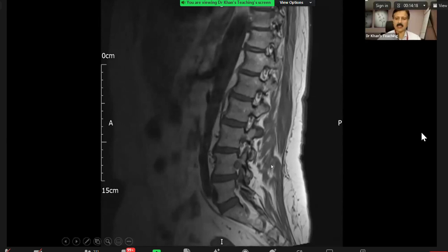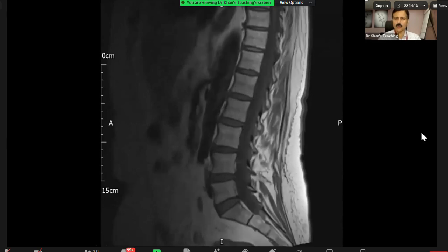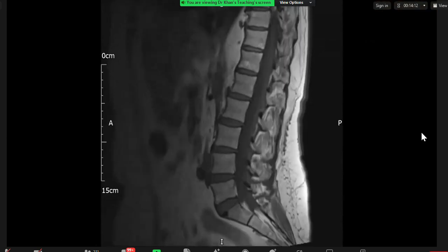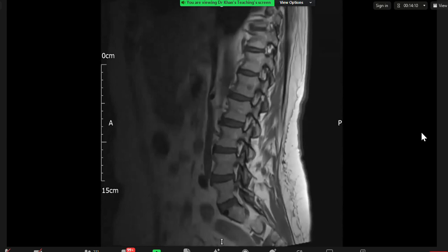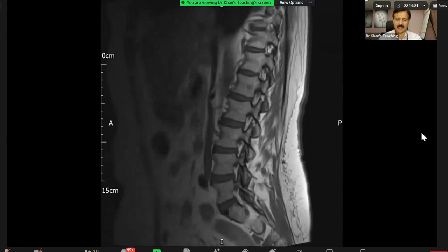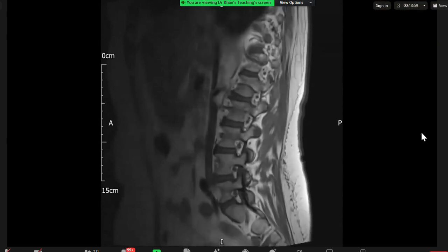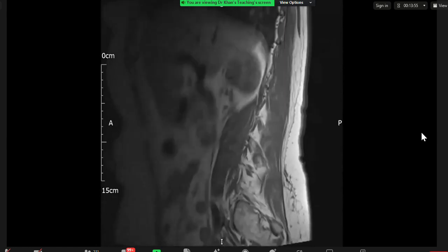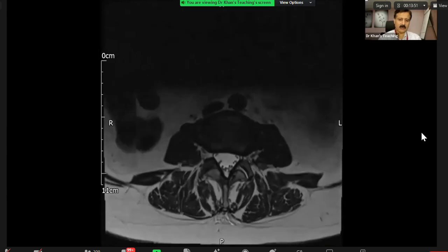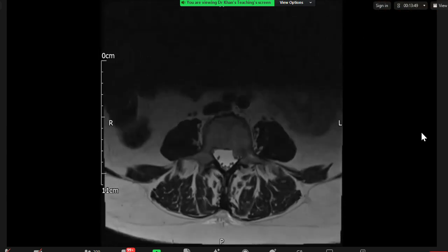Excellent. Next, please. What are you going to do? The Viva question will be? I'll inform the clinical team of the sequestered disc, and I'm also going to. Are you sure it is a sequestrated disc? Can you go to the axial? Yes. Sorry. I'll look at all the sequences available. You see, the morphology of the previous lesion was different. This is different.